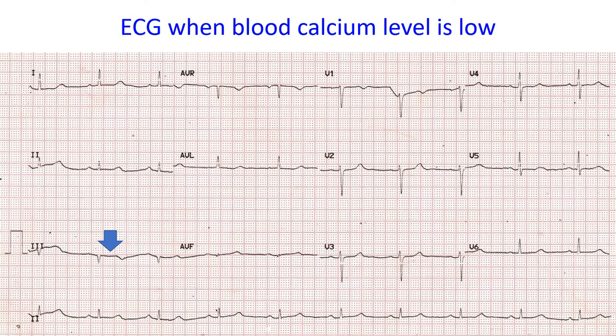The ECG illustrated shows prolongation of ST segment with low calcium levels, as calcium ions are involved in the ion currents during the inscription of the ST segment.